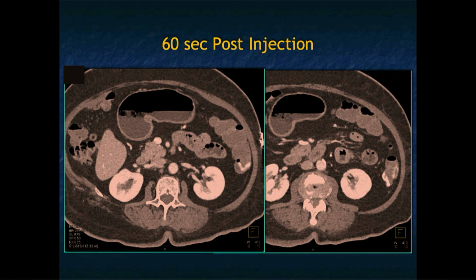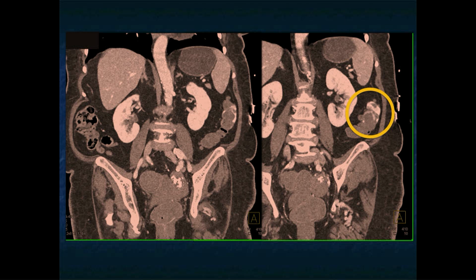Bleeding tends to be about 250 to maybe 350 Hounsfield units. Positive contrast, high-density material impacted in diverticuli, tends to be 500 or 600. You're typically not going to see a bleed at 500 or 600. It's typically, like this case, more like 300. And again, nicely shown on the venous phase, which you can see here as well on the coronal views.